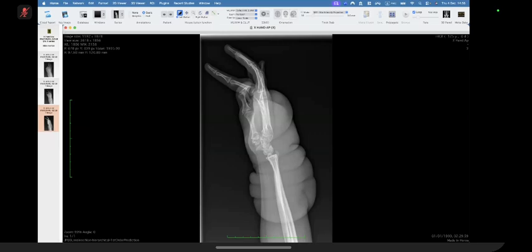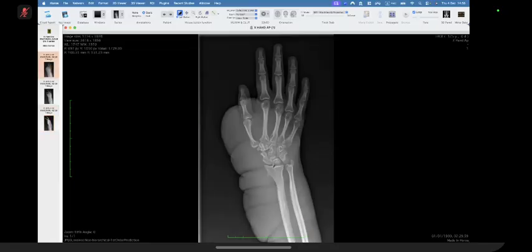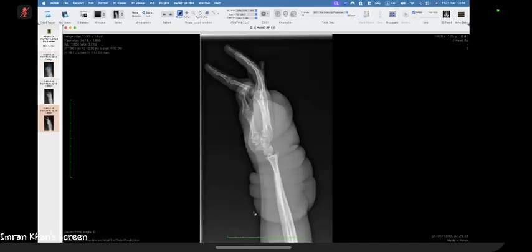Okay, this is a classic Aunt Mini. A lot of soft tissue swelling, gracile bones with a lot of scalloping, because this soft tissue has been there for a very, very long time, and it's affecting the density of the bone as well as causing scalloping of the bone. This is neurofibromatosis, and this is a large, giant plexiform neurofibroma in this patient.